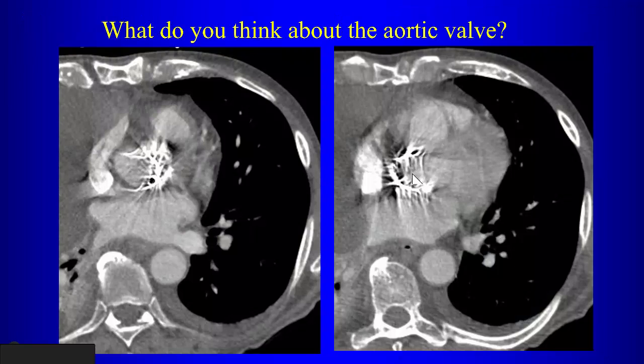So here's a person who has an aortic valve. What's different about this as opposed to the other valves that we've looked at? On metal leaflets? Well, that's true. The leaflets are not metallic. That is true. Anything else? There's no sternotomy, right? So what are you looking at?